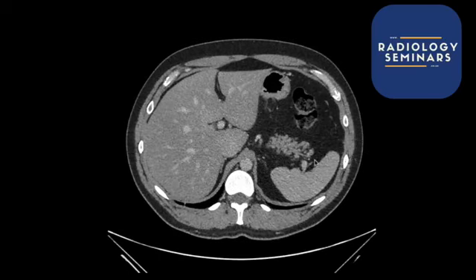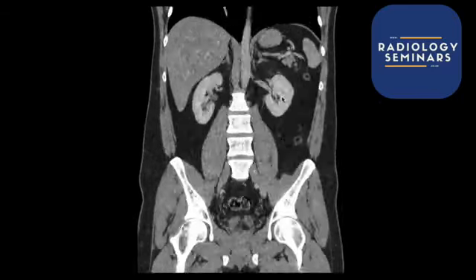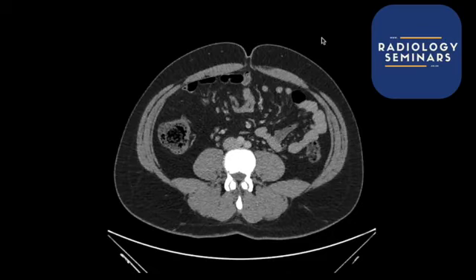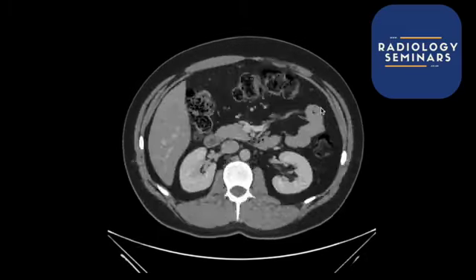When you're trying to measure whether it's big or small, you can measure it in a bipolar length like this. Badly drawn, sorry. And then you could also measure it like this as well. Coronal images go from top like this, and you just draw the line like that, and then draw that measurement there. That's another way to measure it. It's quite important to measure that correctly, because I've seen a few times that people have said that the patient's got splenomegaly, and actually when you look at it in multiple planes, it's okay.